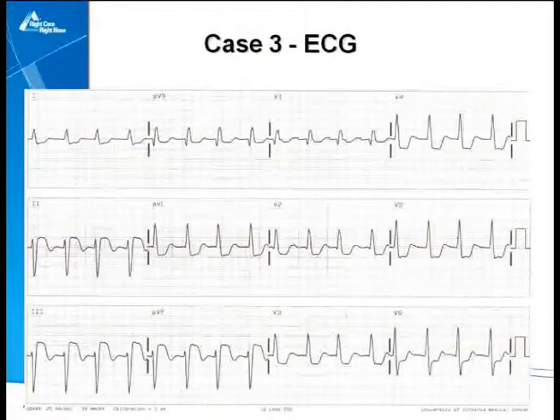So your next thing is to look at the rate. So that's what you should be thinking when you do it. People with mitral valve disease don't suddenly develop AV node reentry. Then the question is, is it sinus rhythm or not? Okay, so then we look at it. The QRS morphology is sort of an incomplete right bundle branch block. Remember, you can get very wide, very sort of funny-looking QRSs in valve disease.